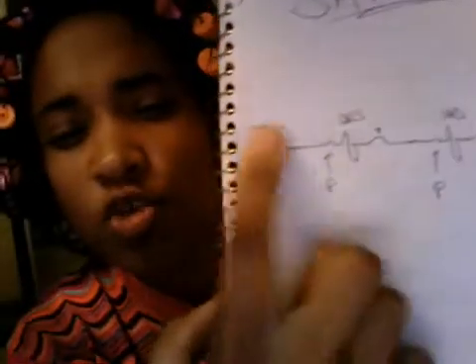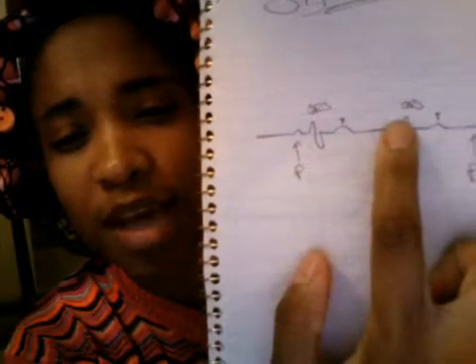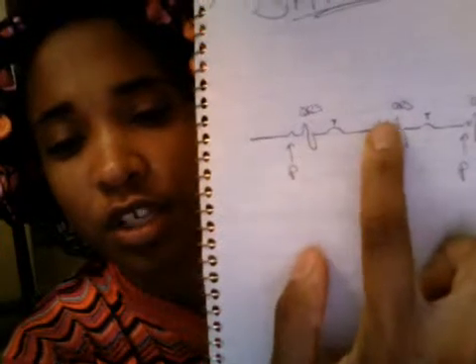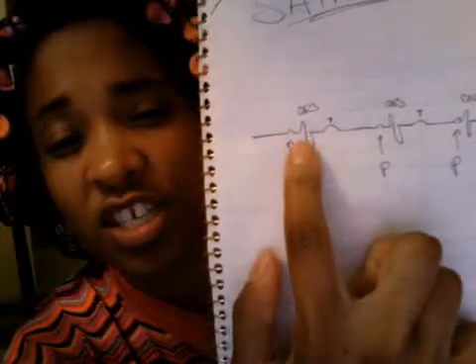When you get that strip, you look at it and you count the big squares. You start at the top part of your QRS. So this is your QRS right here. You start here, and then you start counting big boxes. Obviously, I don't have any big boxes, but you're going to start here and keep going till you get to your next QRS. Okay? So the top part of your QRS, you start at that QRS, that's your baseline. You count. Once you hit that next heavy line, you say 300.